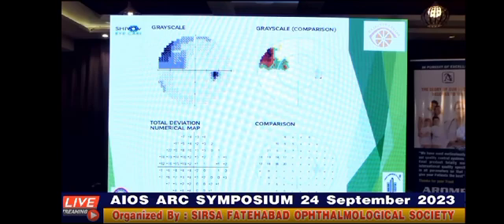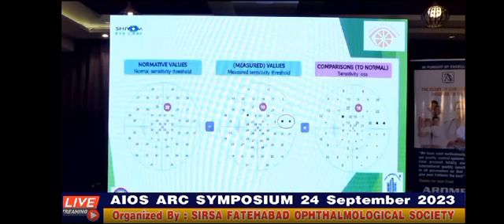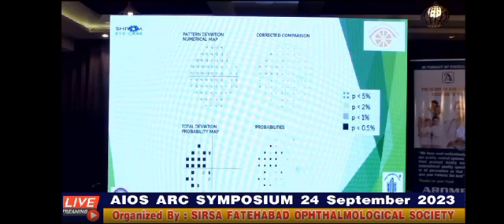Both the parameters display sensitivity loss in total deviation map and the comparison, but use opposite signs. The Octopus parameters display a sensitivity loss less than 5 decibel with a plus sign. Now here the red circle is pointing towards the dark black squares, which signifies an absolute defect, that is the sensitivity threshold is 0 decibel. Both the parameters display the local sensitivity loss, that is the deviation from age-corrected normal values, with the correction applied to eliminate any influence of diffuse loss, but here they use opposite signs.